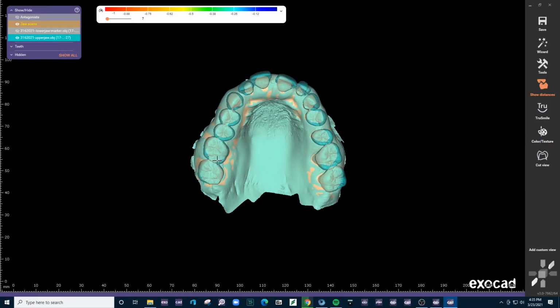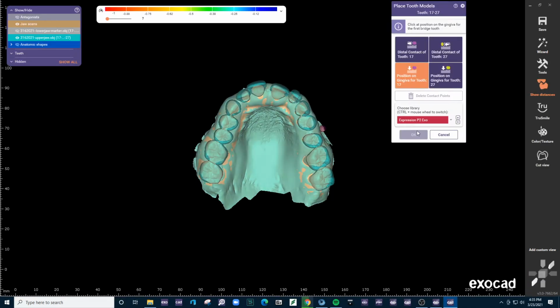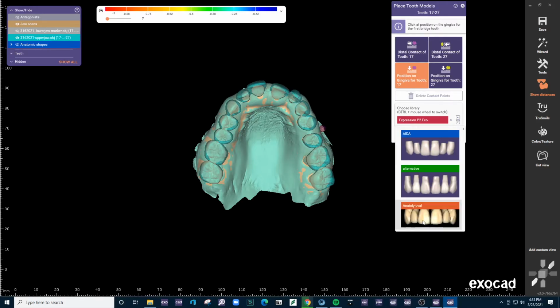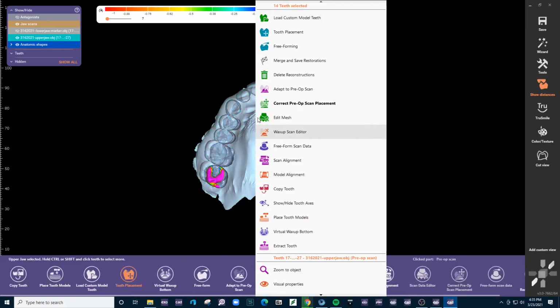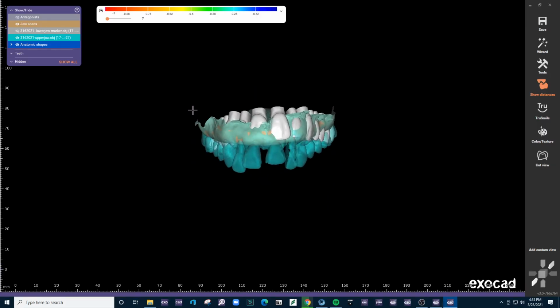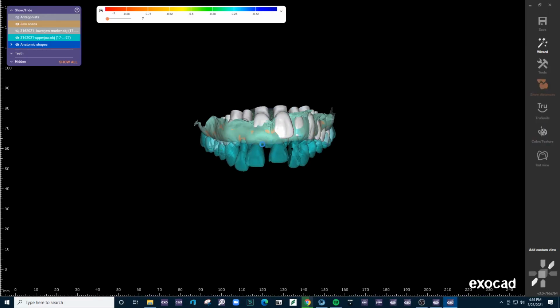Now we'll go into the monochromatic mode instead of color texture. The best molds that are out there, I think, are these Anatolis, and I think the triangular option would probably match this patient a little bit better. Let's see how this works first.